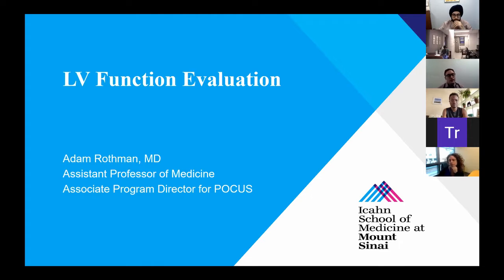Obviously for those who have done the ultrasound elective or have a background in ultrasound, whether it's prior training, this may be a bit of a review. But it doesn't hurt to hear things and see things more than once. So we're just going to broach a very narrow topic today, where I'm going to go over the ways that we evaluate and assess LV function at the bedside. It may be different than what the cardiologists look at, and so I'm going to go through a series of samples and discuss how we describe something as either hyperdynamic, normal, reduced, or severely reduced.